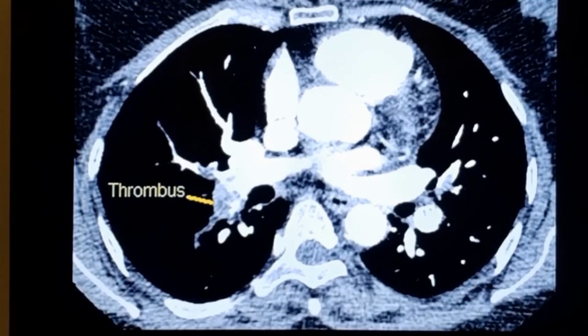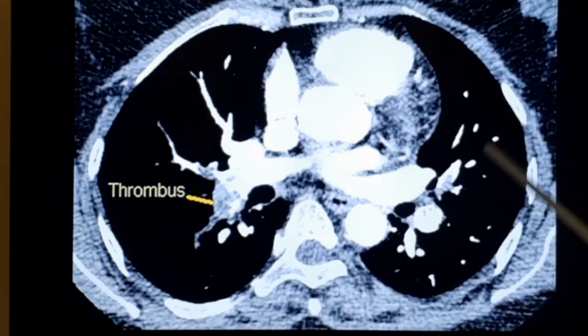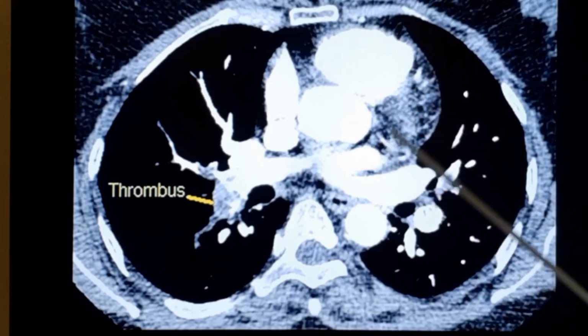This is a section from a contrast-enhanced CT of the thorax. These are the cardiac chambers. This is descending aorta, vertebra, and the rib cage. Lung is not seen well because this is not a lung window. It is a vascular window. Only the contrast-enhanced regions are seen. Myocardium is seen as partially contrast-filled.